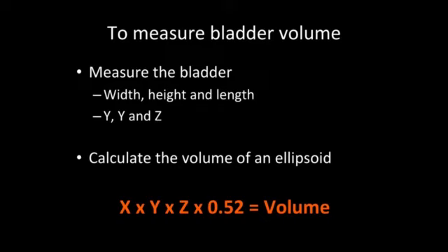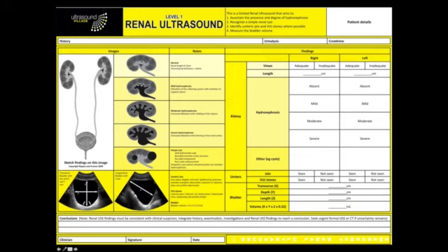Just going through this report again, you can see here some pictures of the kidney and bladder. You can draw on this bit to say what you found, and you can write your report on this side. And here's the aide-memoire: mild hydronephrosis with dilation of the collecting system and retention of the cupped calyces, moderate hydronephrosis with dilation and clubbing of the calyces, severe hydronephrosis with increased dilatation and thinning of the renal cortex, simple cysts which are well defined with a thin wall, rounded anechoic cystic structures, no solid components, posterior cystic enhancement, and parapelvic cysts and an extrarenal pelvis can simulate hydronephrosis.